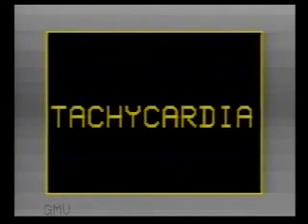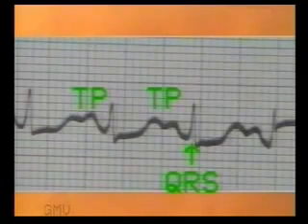Tachycardia. Tachycardia has to be differentiated mainly by its origin, whether it is sinus tachycardia, paroxysmal supraventricular tachycardia, ventricular tachycardia, or atrial flutter fibrillation. First we have to see whether the QRS complexes are normal or abnormal and whether P waves are present. If the QRS complex is normal, it means that the origin of the tachycardia is above the AV node, sinus or supraventricular tachycardia. Presence of P wave is another definite indication of supraventricular origin.